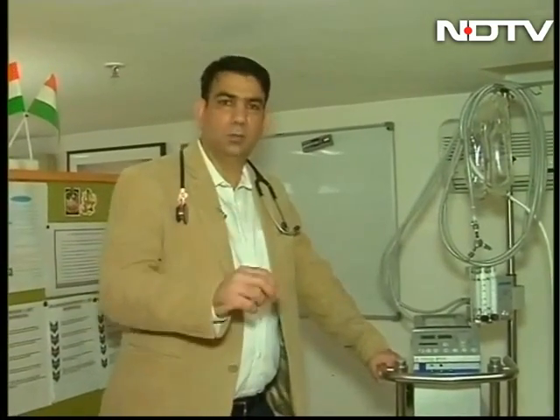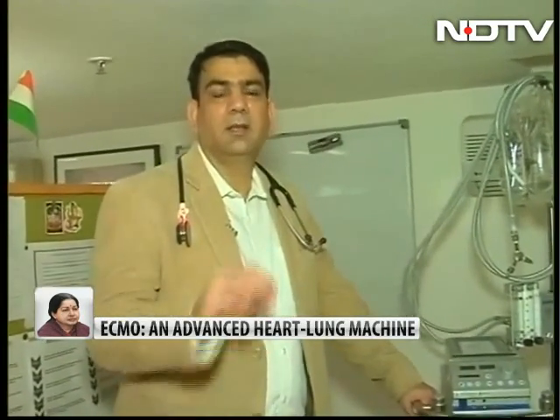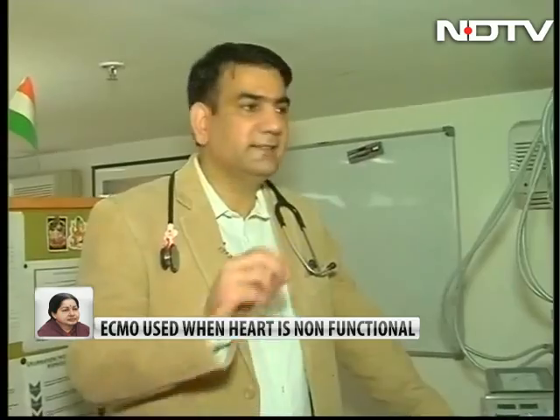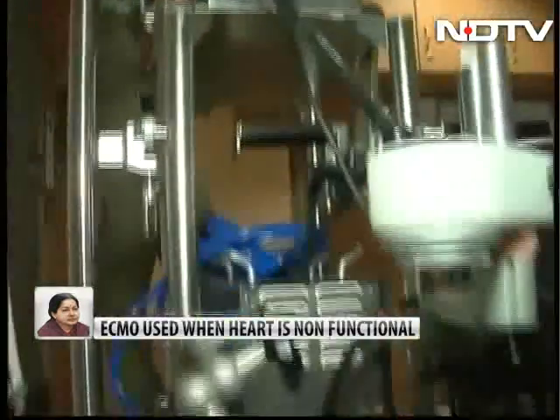So when would you use ECMO? ECMO should be used in the situation when your conventional therapies fail and the patient is not improving. That's the time when you think of a rescue therapy, and one of the rescue therapies is ECMO support.